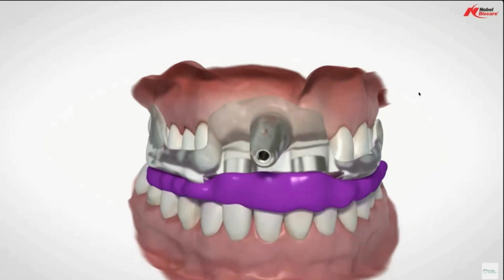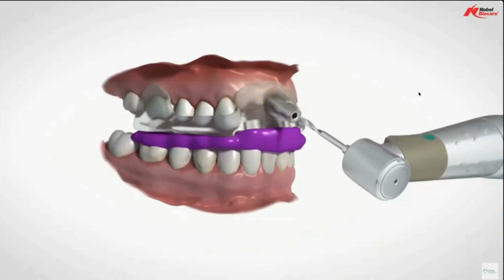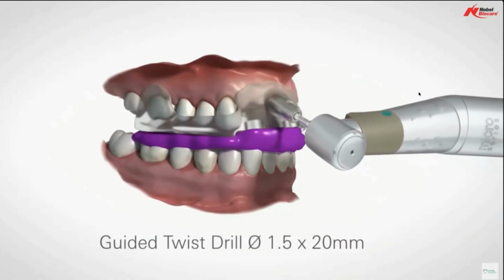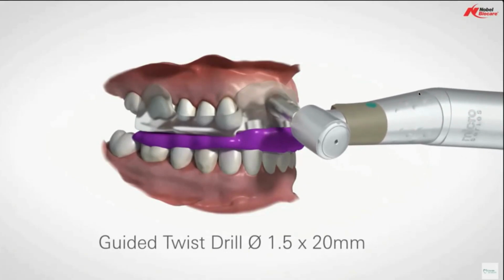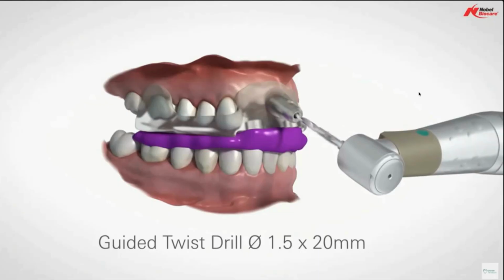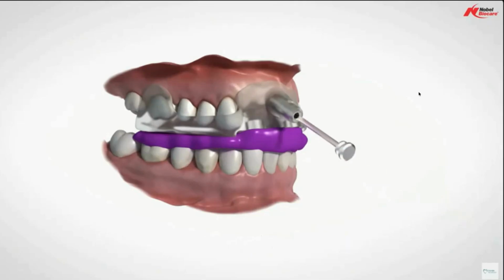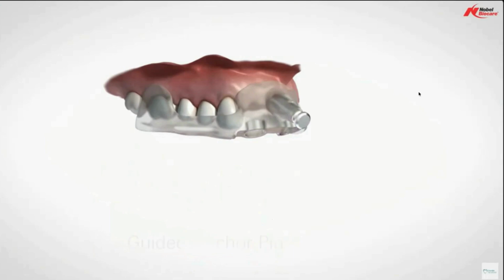The surgical index essentially is like a bite registration. You don't have to do them in all cases if you have a nice stable seating of the surgical template. Sometimes we use anchor pins. This anchor pin is a 1.5 millimeter drill that goes in laterally away from teeth, of course, vital structures, and away from the implants. This is just there to lock everything in place.